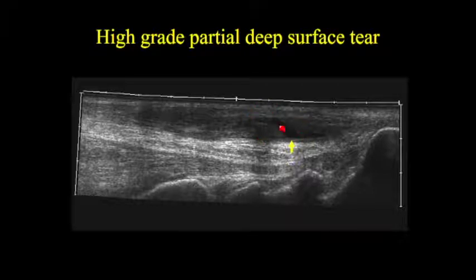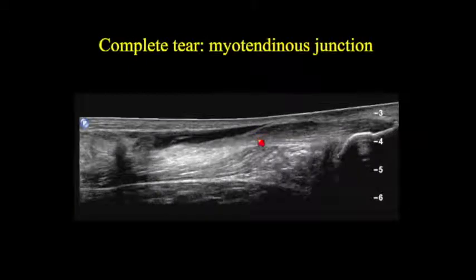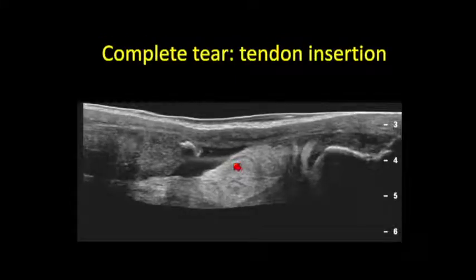So this is a typical place where we would look for partial thickness tearing in an Achilles tendon, for instance. Now, when you have a complete tear, you expect to have retraction of the torn ends, and what we see really depends on whether or not the tendon is situated with an intact peritenon or tendon sheath. So in this case, we have a complete tear, we have retraction of the two ends, but the peritenon is intact, and we can still see this hypoechoic column of soft tissue or fluid corresponding to organizing hematoma or seroma within the intact peritenon.